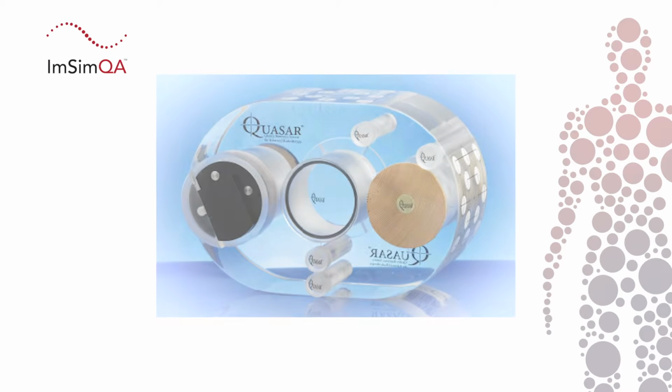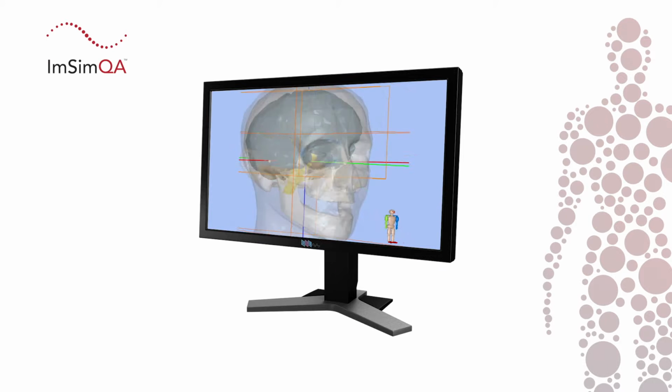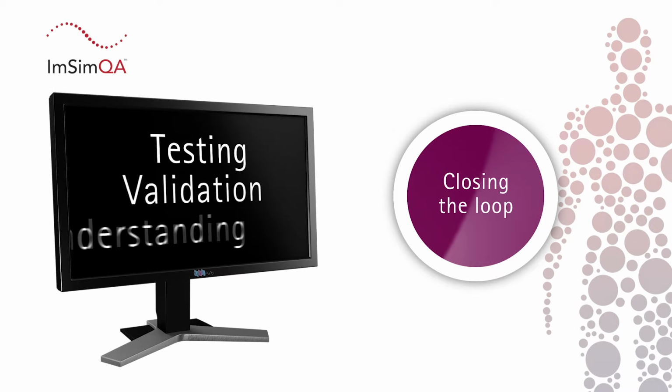The software includes a library of virtual phantoms, or the user can import their own DICOM images for testing and analysis. ImSimQA closes the loop of testing, validation and understanding.